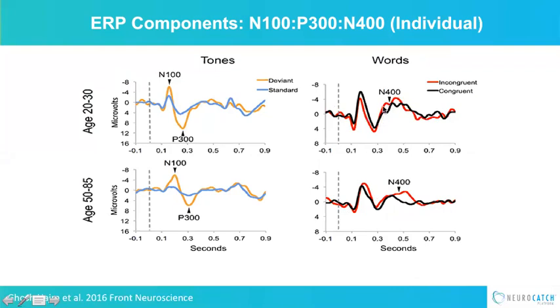This is actually breaking down that speech information. So when you hear something unexpected, the first thing you hear is an unexpected sound, and that's this peak right here. And then you start to process that it didn't fit the meaning either, and that's this peak right here. Notice that this does change a little bit in this particular example of a young adult versus an older adult, and that is an important thing to pay attention to, and we'll get into that a little bit later.